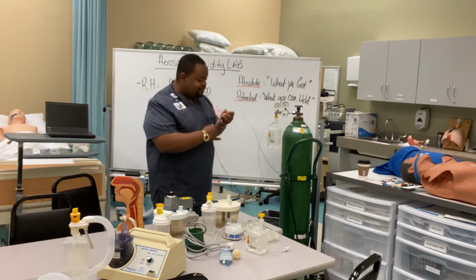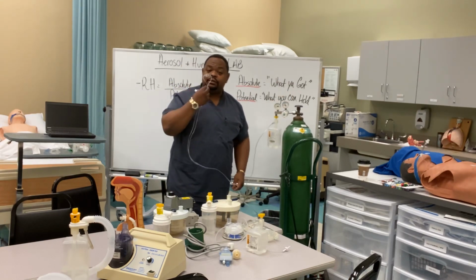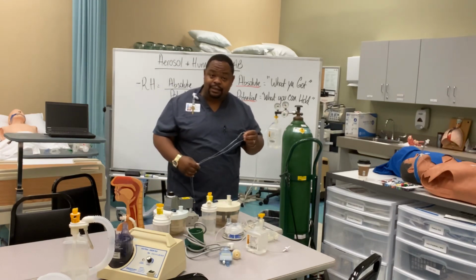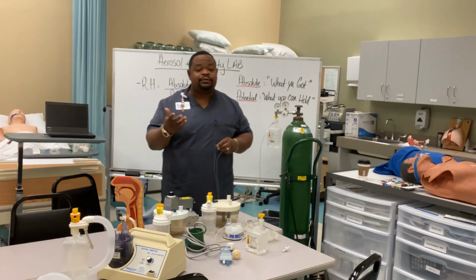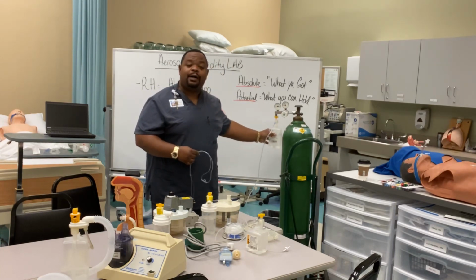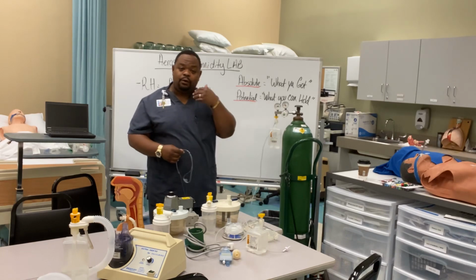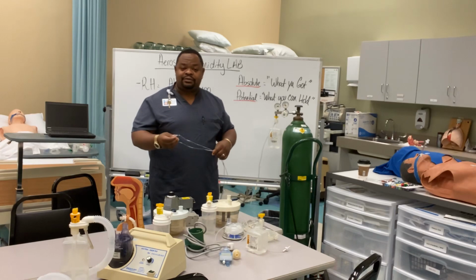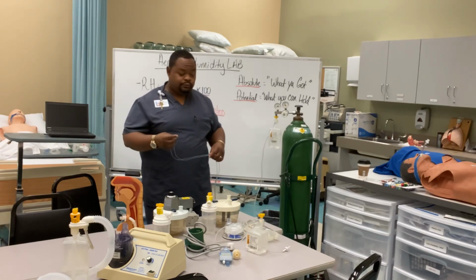This will moisten the dry gas that's delivered to the nares, because medical gas is very, very dry, right? So after about 3 liters or 4 liters, you want to make sure that your patient is on a bubble humidifier so that they don't bleed, become really, really dry up in the nares and very, very uncomfortable, right?